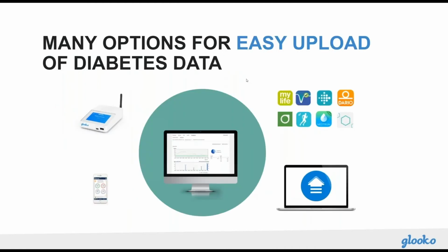Now, the diasend platform is made up of multiple different parts. We have in the top left here the transmitter. Now, this is obviously sat within clinics, and it provides a fantastic hub for the uploading of device data across all types of diabetes devices. It has connectivity via cable, infrared, Bluetooth, NFC, really providing a broad range of device compatibility.